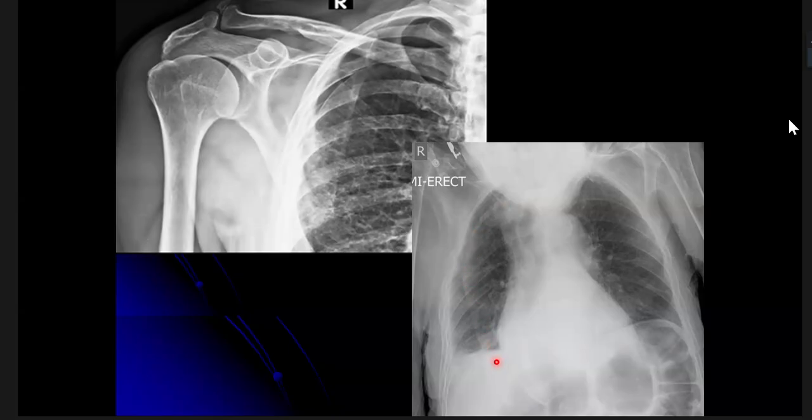See here. So if you consider pneumothorax, it's a pathology of the pleura. Pleura won't extend beyond the chest wall. So that is the first important point. Look at the thickness, it's almost 6 to 7 mm. The pneumothorax pleural line is never more than 3 to 4 mm in thickness. And the most important specific feature is the presence of bronchovascular markings. I'm seeing bronchovascular markings present.